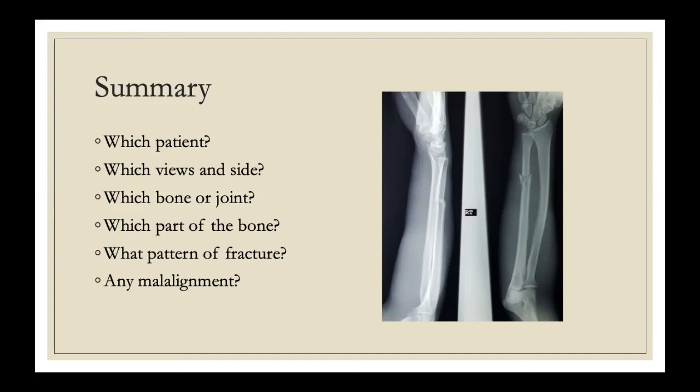So that's it. Now, in the next part of this lesson, you're going to be allowed a chance to practice these newfound skills. And we're going to look at some X-rays, and you're going to try describing them.